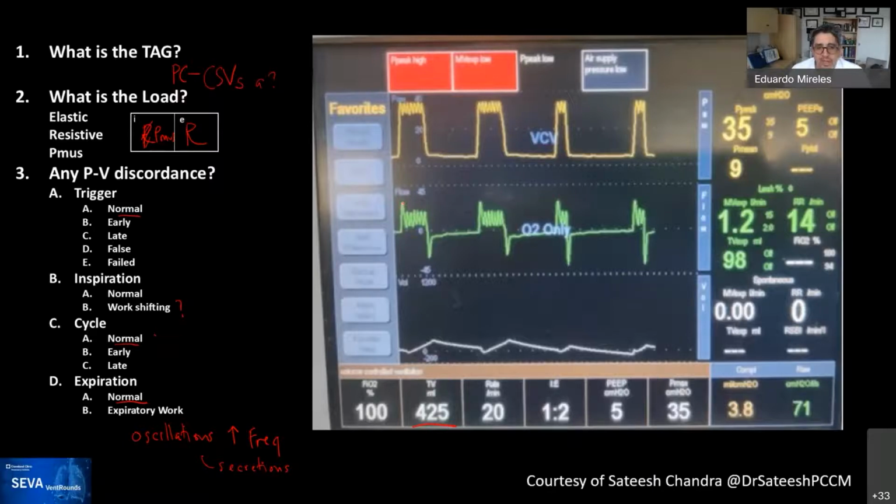You see the pressure rises and it reaches a peak, and then it kind of goes down and starts oscillating up and down, and then it ends and goes down again with a high peak, and then, as you mentioned, this pattern that looks like a high resistance. And I agree with you. Up here, it looks like pressure control.